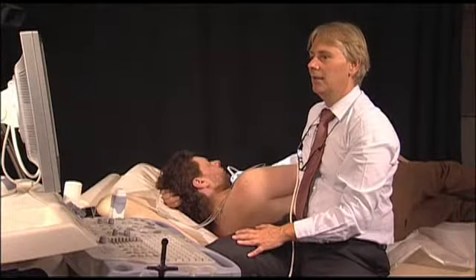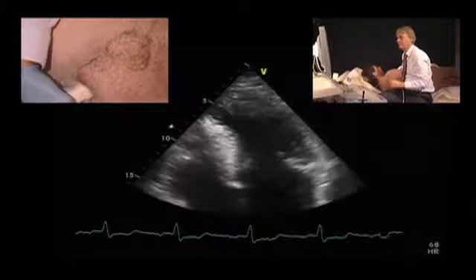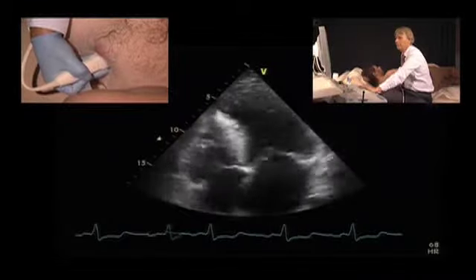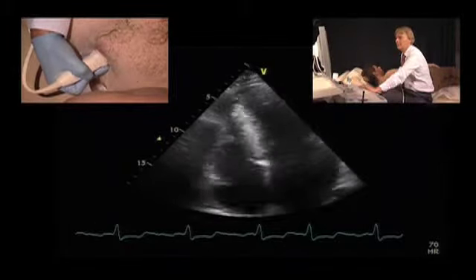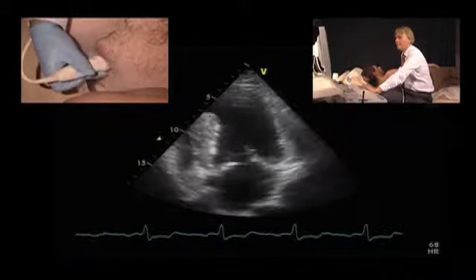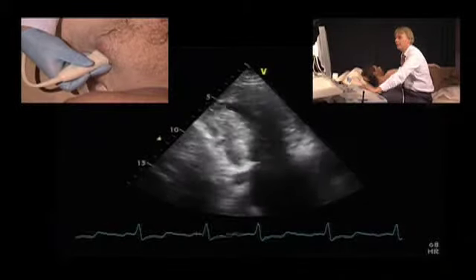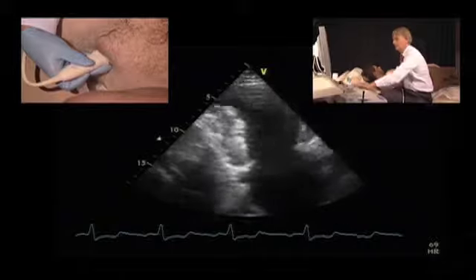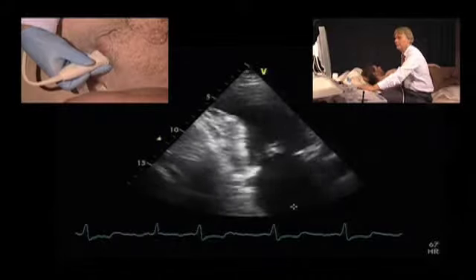And then I would turn to the 4-chamber view, to the apical position, and again look at the extent and severity of left ventricular hypertrophy. You see that the septum is most prominently hypertrophied, maybe the apex not as much, and certainly not the lateral wall. Here in the 2-chamber view, we see that the inferior wall is also thickened, and the anterior wall, we see that there are echogenic structures here in the septum, probably due to fibrosis.